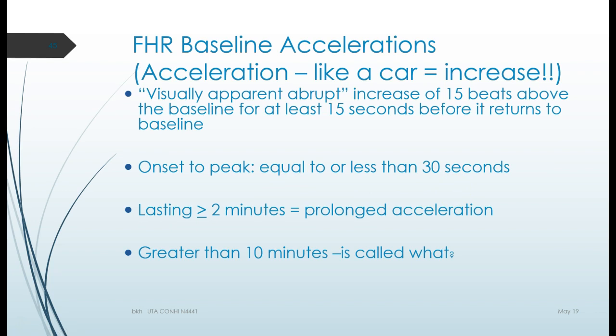When we're talking about our baseline, anything that happens and lasts longer than 2 minutes, we're going to call a prolonged, whatever it is we're talking about. If something on our baseline happens for greater than 10 minutes, then we call that a new baseline. 10 minutes to establish a baseline.